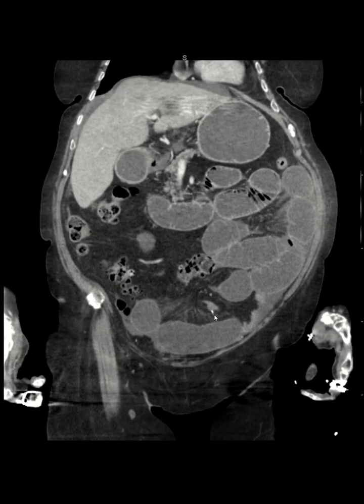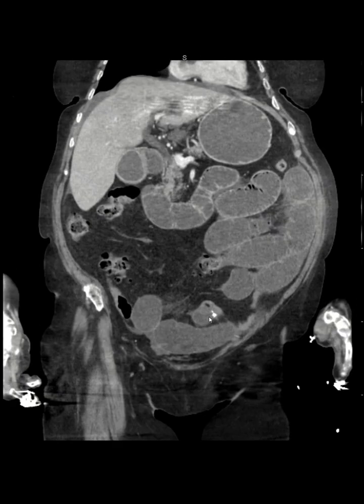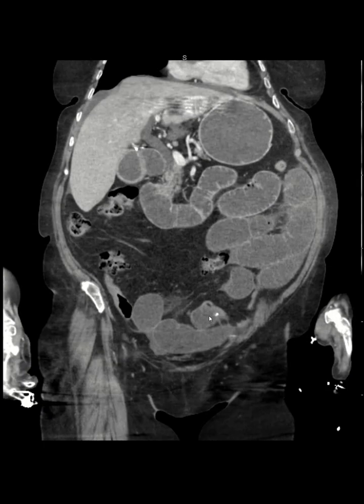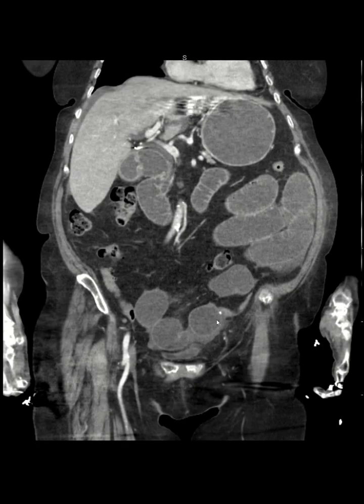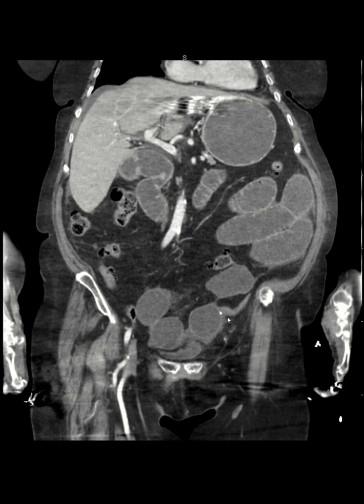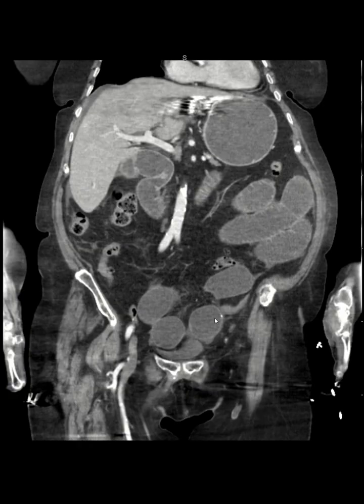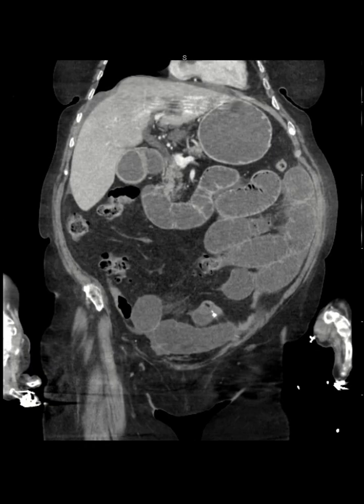We can see that there has been a prior anastomosis, and at the site of the anastomosis, we have the site of obstruction or the transition point. This part more proximally that we have followed from stomach to this point is dilated, and more distally it's collapsed, right? So that's the transition point in the distal small bowel in the left lower quadrant of the abdomen. So that's the way to find the transition point and to tell your surgeons where the transition point is located.